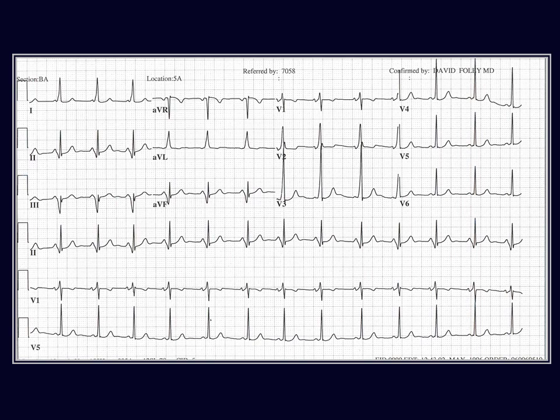which generally would put you towards the right atrium if it is positive. However, the strong R wave in V1 with early transition, along with the inferior negative pre-excitation, would suggest it could be posteroseptal mitral annulus, or it could be posteroseptal tricuspid annulus, or even coronary sinus.